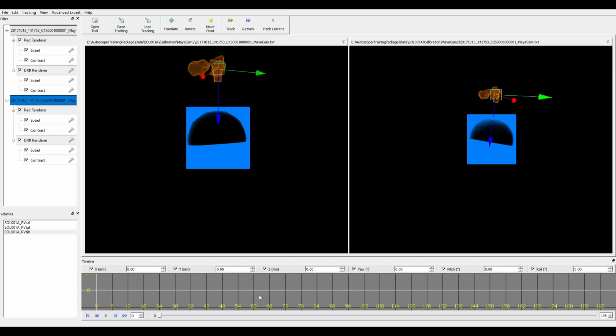I work with a lot of X-ray, so we need to use some X-ray tracking software to be able to find the 3D positions of the various bones that we're tracking. I'm going to do a slight follow-up to Bardi's video and show how I use the multi-bone tracking and how our visualization of these bones works. This will just give an overview of my workflow.